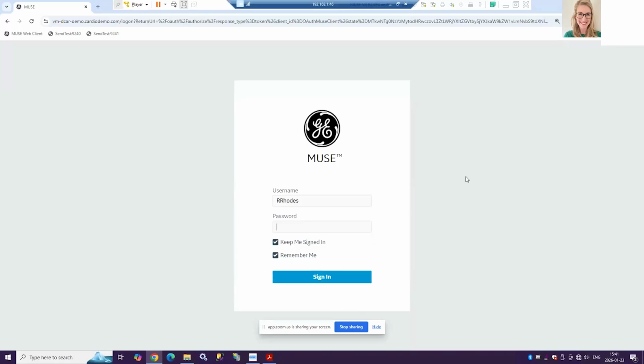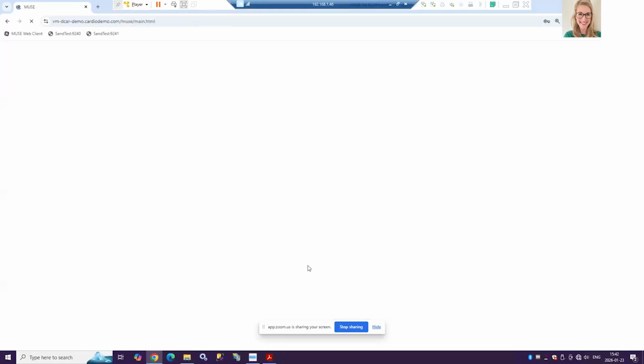There are a few questions in the chat, so I can read them out while you may want to show exactly how to do that in that case. Okay, first question: besides doing free text interpretation, can you do copy and paste into the interpretation box?